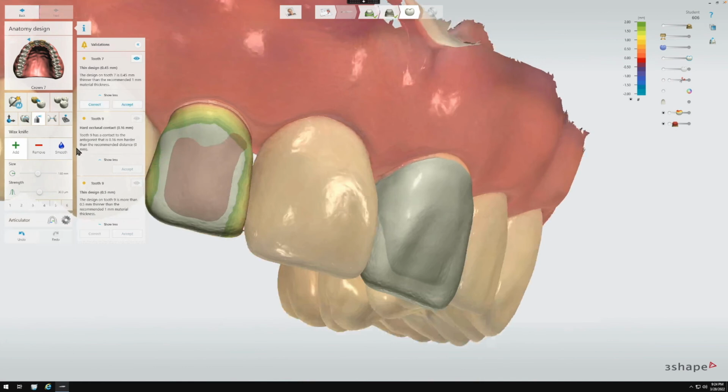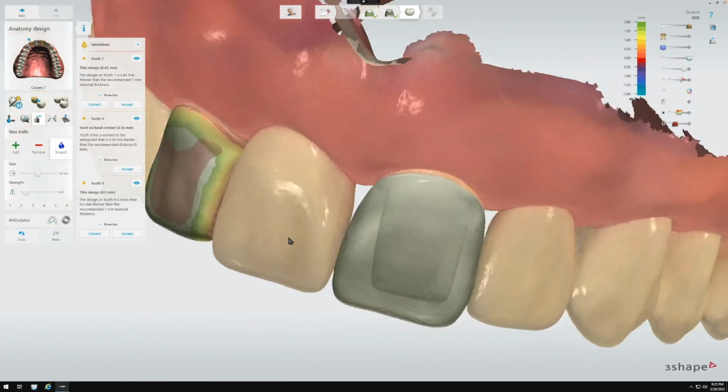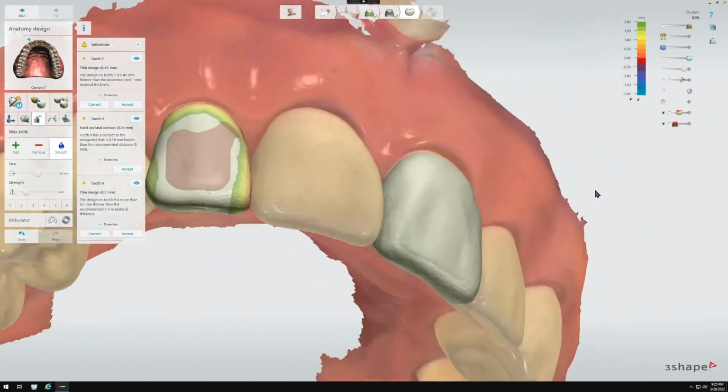Okay, so I'm going to go ahead and use smooth at this point, and you can kind of see how it kind of pimples out a little bit, kind of bulges out. I'm going to go ahead and smooth it, and it's going to smoothen everything out. So I'm just left clicking and holding here, and you can kind of see that's looking a lot better. All right, I like it. I think now we're pretty good.